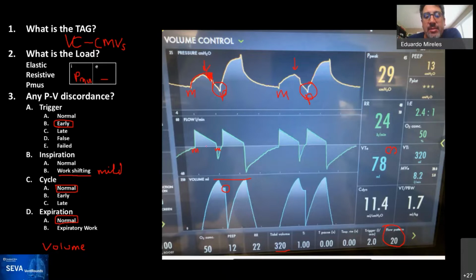And then the patient triggers another breath. And when the patient triggers the other breath, the ventilator delivers another breath. You can see that it's exactly the same size as the prior one. So one after the other are identical. But the difference here is that if you see the pressure that the ventilator used to deliver it went way up. And that is a manifestation that this patient got this tidal volume on top of here. So essentially, if the graph was not reset, the tidal volume would have gone all the way up here. And then the patient starts exhaling all the way to get to zero.